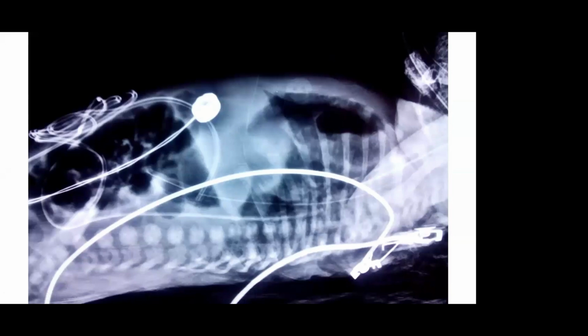Okay. So here, can you tell me which catheter is what? Which one is this catheter? And which one is this catheter? Yes, it is a curved UVC. Okay, yes, it must have gone into the liver.